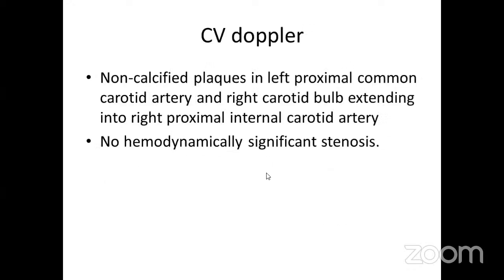On the carotid Doppler, there are non-calcified plaques in both the right and left carotid arteries, without any hemodynamically significant stenosis. What is the cause of the recurrent stroke where there is no hemodynamically significant stenosis despite extensive evaluation?